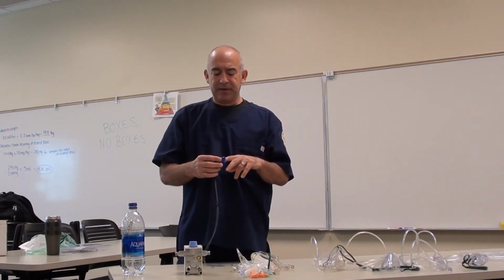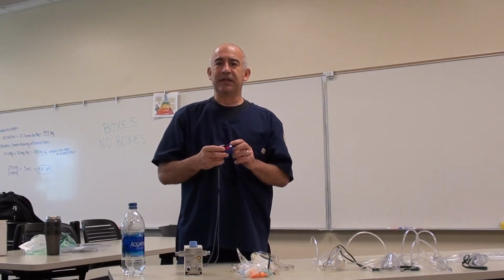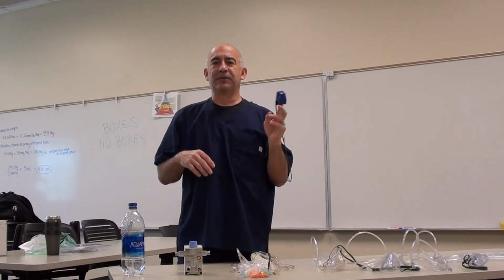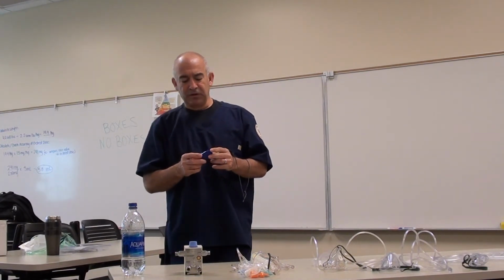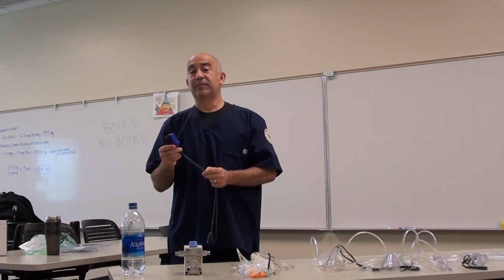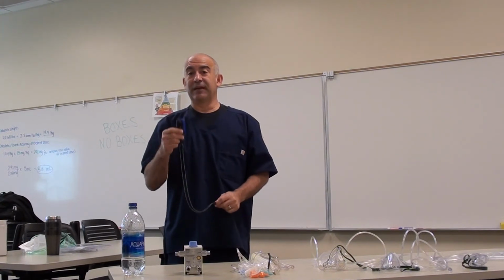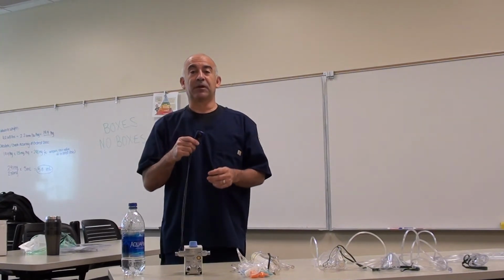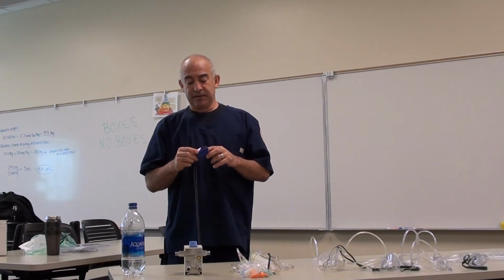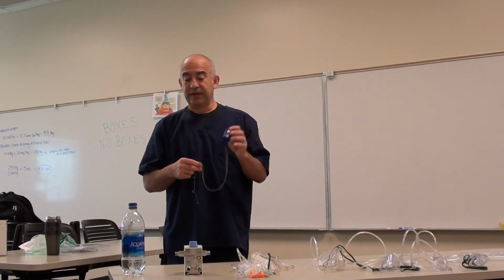That's because the person may have fingernail polish, they may have super dark pigmented skin, or they may be waving their hands around and talking with their hands. What would also give a false reading on this particular device would be a person that's in shock and a person that is suffering from carbon monoxide poisoning, as this device does not distinguish between the carbon monoxide in the blood and the oxygen saturation of the blood, therefore giving a false high reading.